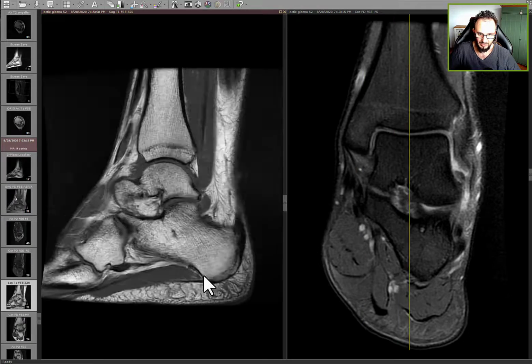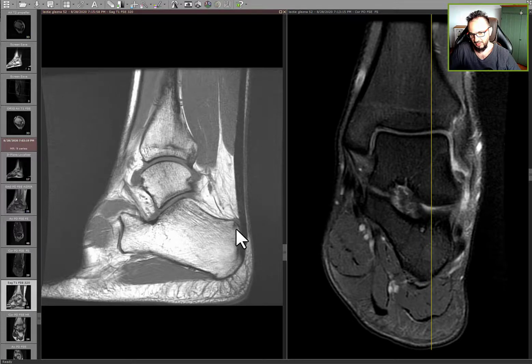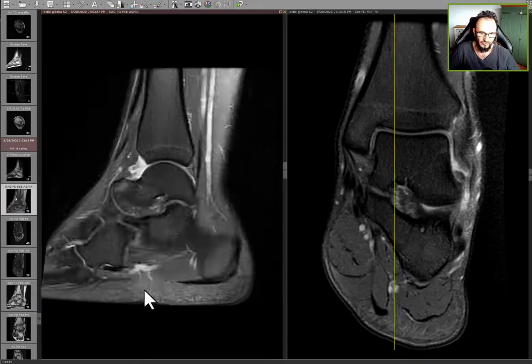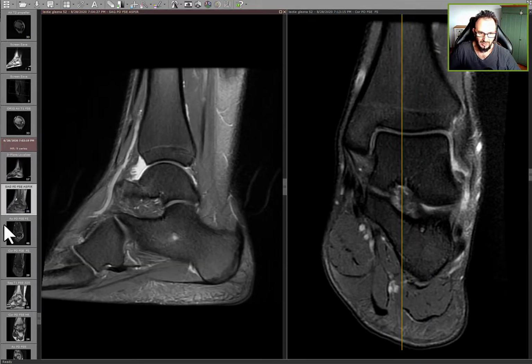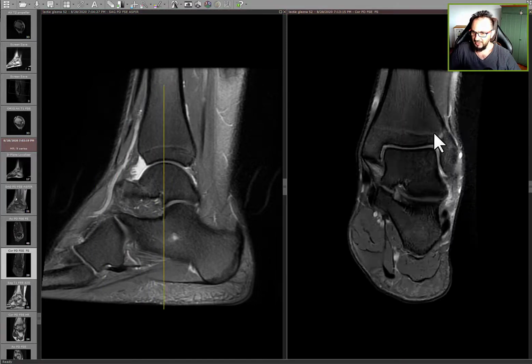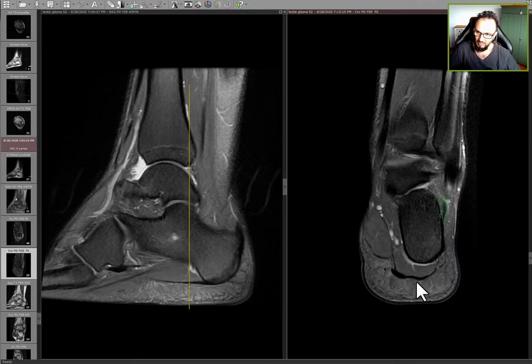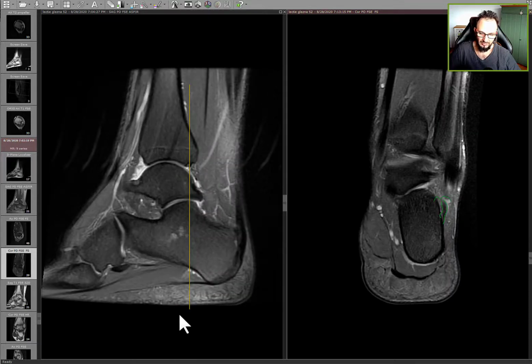Let's see what happened with the stress fracture line. Seems to be almost completely resolved. There is no other issue. There is still some inflammation here, and also the metaphyseal changes from here and from here seem to be alright. So probably they are only physiological due to overuse.